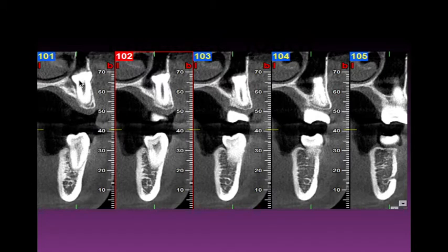What this also tells us is that the crown of this impacted tooth, although very high, is closer to the buccal cortex rather than the palate. So if I'd like to remove this, except if I want to pull it out, which is rather hard, through the apex, then I'd rather open up through the buccal cortex rather than access it to the palate because this is thicker compared to this one.